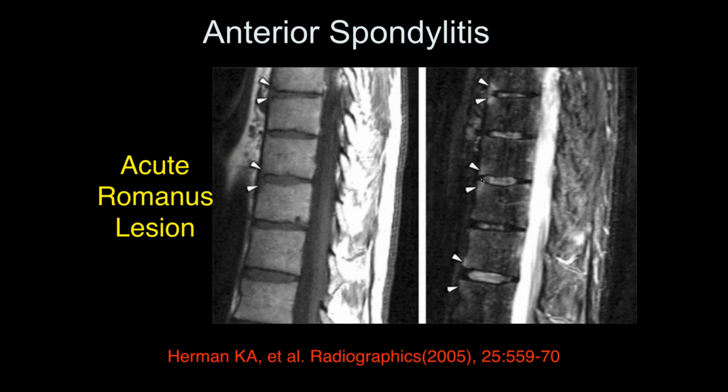The syndesmophytes are often difficult to see on an MR because the syndesmophytes are black and the anterior longitudinal ligament is black. So we typically can't see the syndesmophytes until after they're really chronic and they start developing fat and marrow space within them. But what MR does is pick up the inflammatory changes here, and these are at multiple levels.